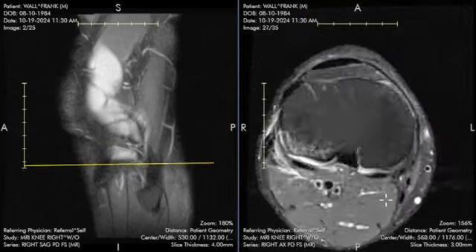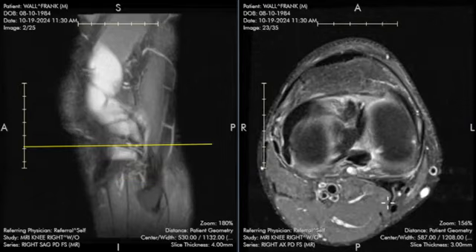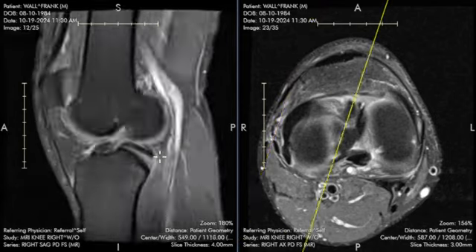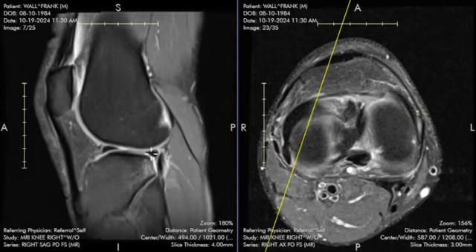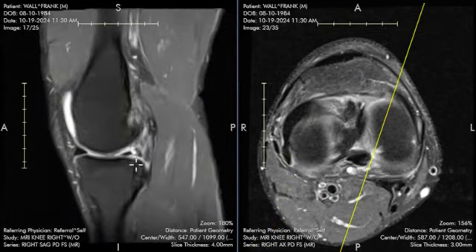So that brings me to the end of your exam. The remaining structures that I have not mentioned are intact and normal. The remaining ligaments and tendons are normal. The rest of the muscles are normal. But again, a complete tear of the ACL and multiple tears of the menisci are something that deserve the attention of the orthopedist, and they can decide if surgery is necessary in order for them to heal properly.